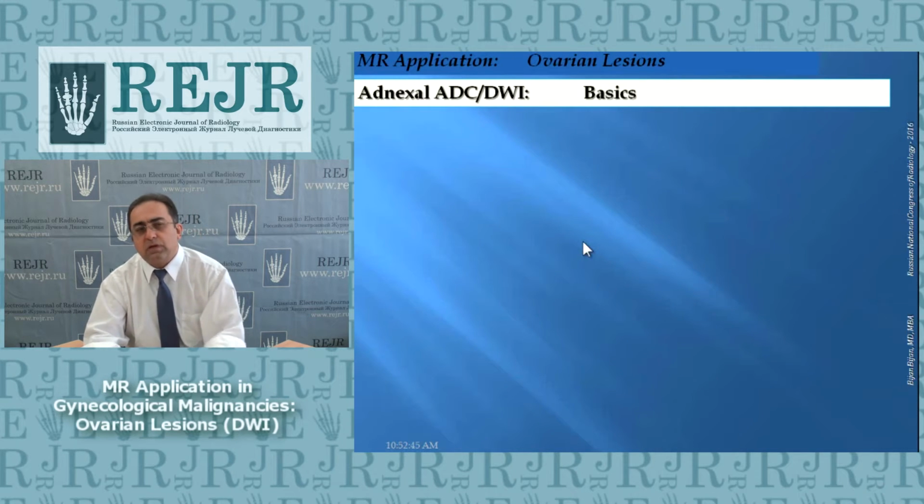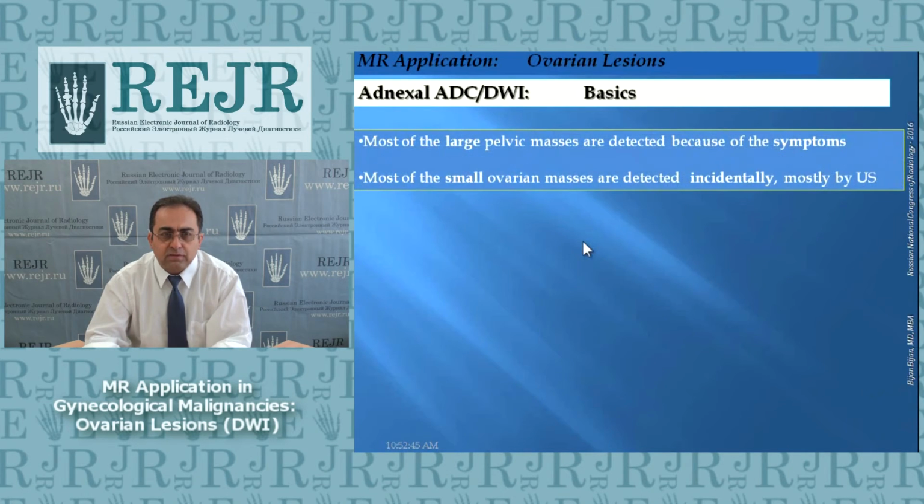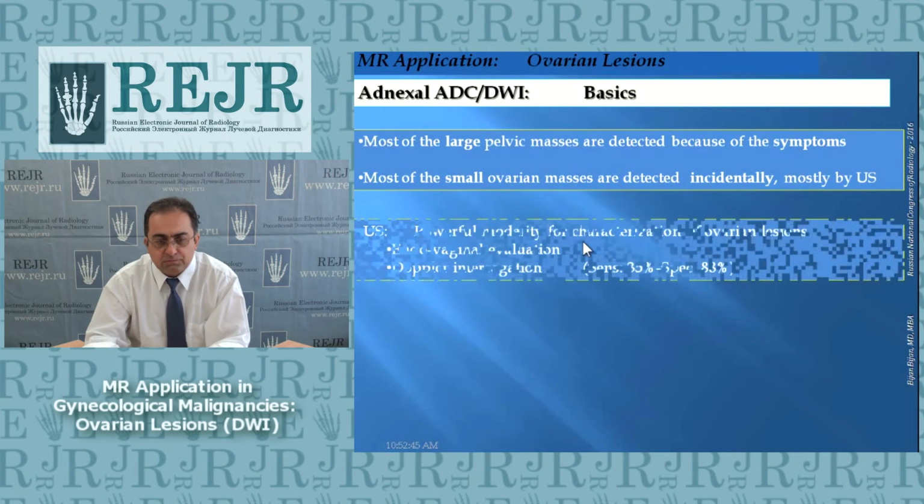Let me start with some basics about ovarian cancer imaging in general. Most of the ovarian cancers are small and are detected incidentally. Some of them are really big and they can cause symptoms, and then they present with a large pelvic or even abdominal mass as the initial presentation.